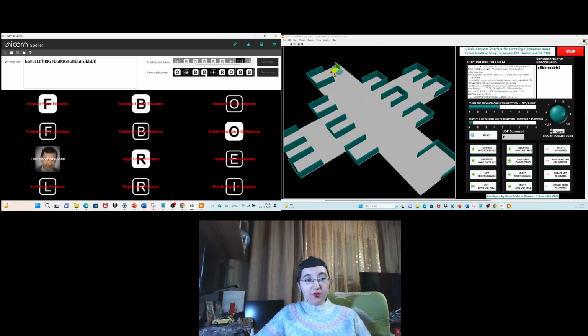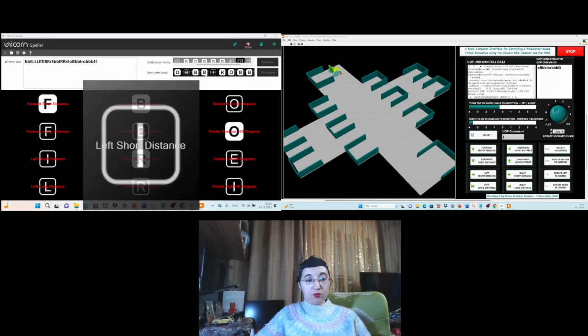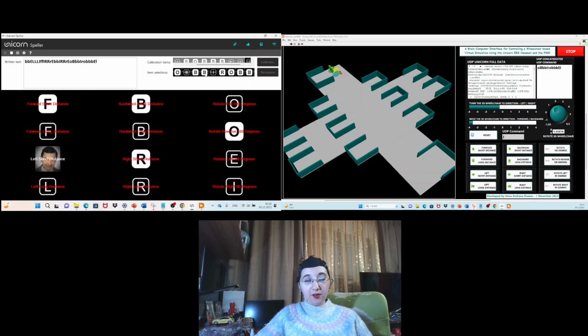Left short distance. Yeah, that's perfect. Left short distance was executed. Let's continue. Again, the same command.